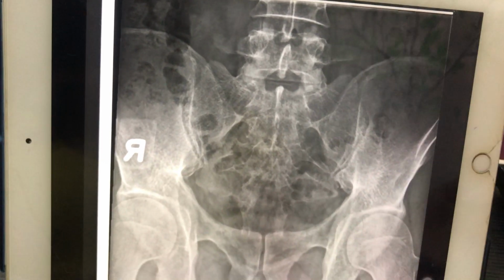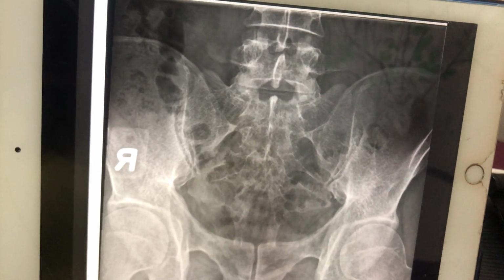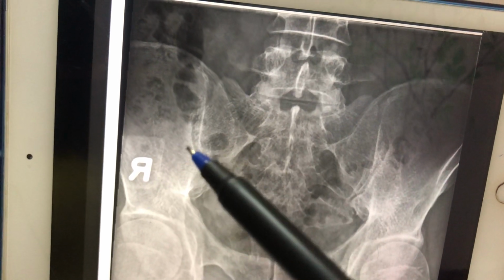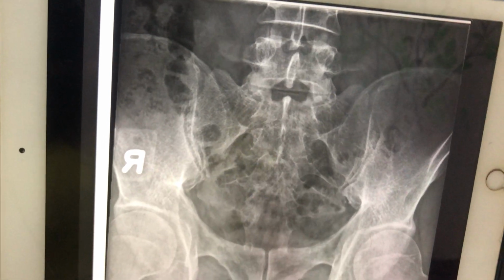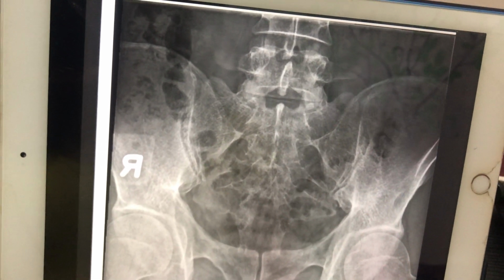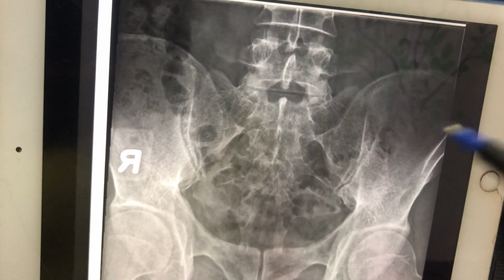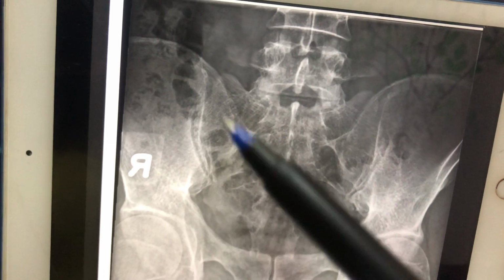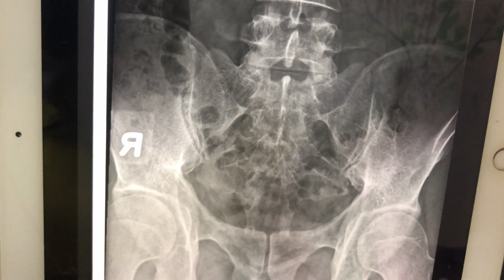So what is the significance of this? When the changes of spondyloarthropathy start, it is the lower 1/3 of the SI joint that is involved, and it is the iliac surface that is first involved, right? So of course later on in the disease there can be calcification within the syndesmosis, there can be calcification within the articular cartilage, but initially it is the lower 1/3 that is involved because that is the part that is covered by synovium, right? So this sacroiliitis can actually be graded.